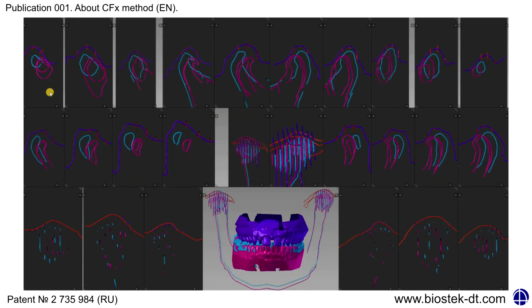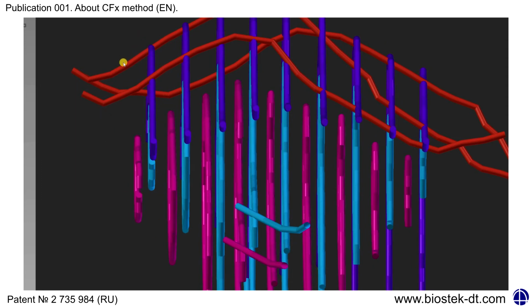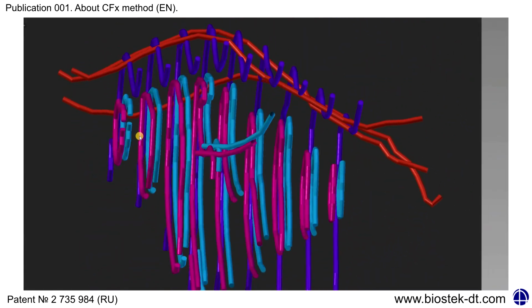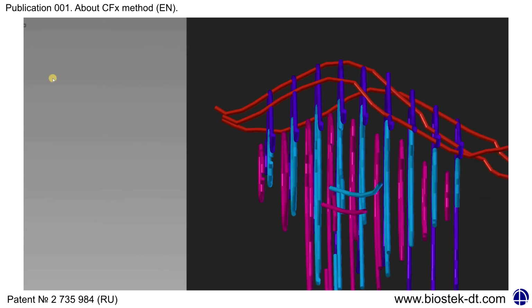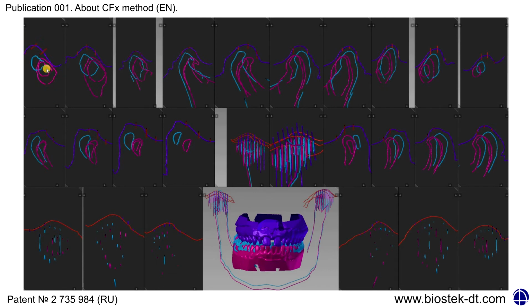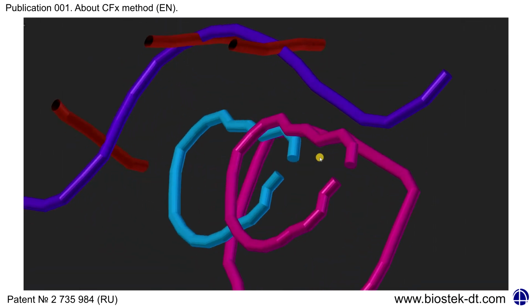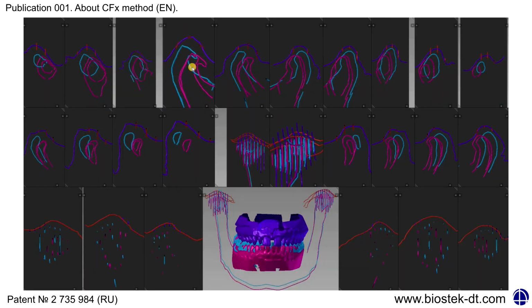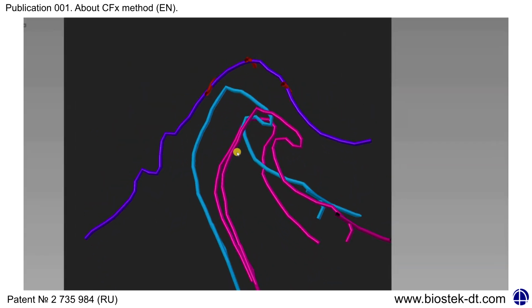A complete diagnostic 3D scene is created with the possibility of detailed analysis of TMJ. To show an example of visualization, let's take a look at the mandible protrusion position. Evaluation of 3D models of the right TMJ shows a side shift of contours of the condyle outward. There is a possibility to evaluate the movement of condyles on the level of each individual 3D contour. Precise control of distance and joint space on any side of interest. Exceptional level of precision in visualization.